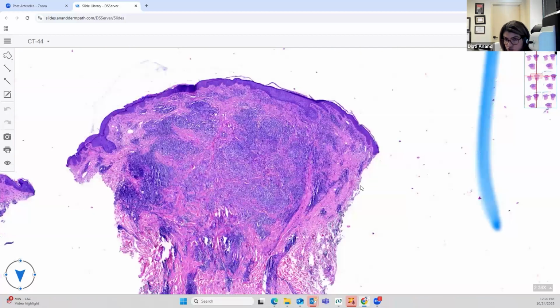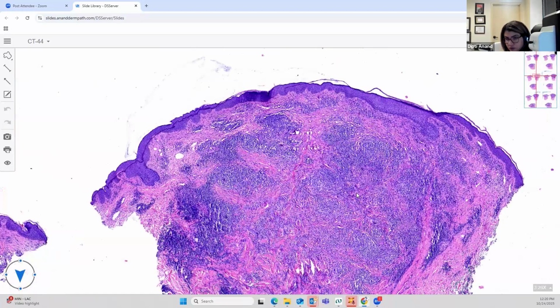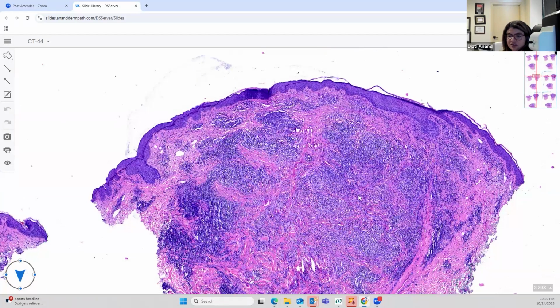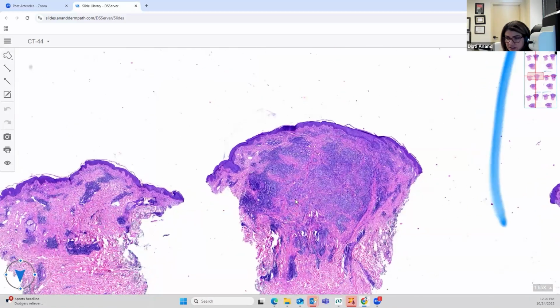So essentially, you don't need to do anything. CD123 is a stain for lupus, so we don't need to do that. We don't need to do infectious bugs. We don't need to polarize it. This is a very classic pattern, this kind of wedge-shaped perivascular infiltrate. So again, a lupus-like infiltrate, but with eosinophils and with this pallor in the center. This is the pallor in the center where your tick portion is probably hiding.